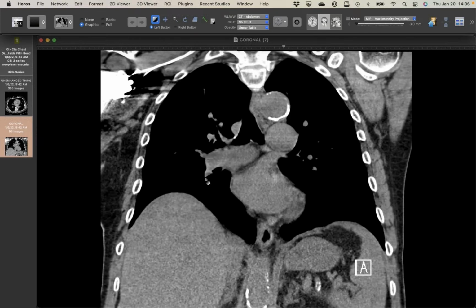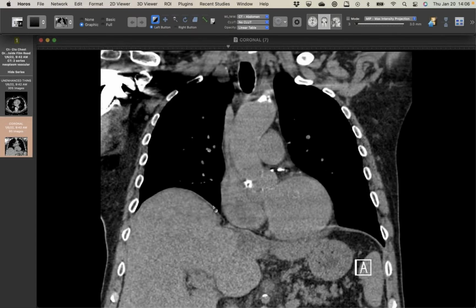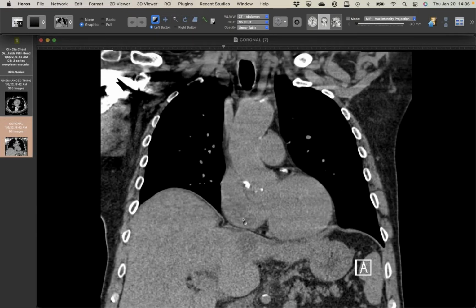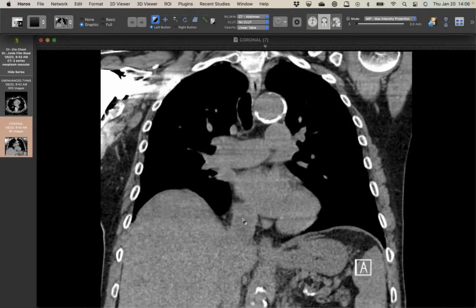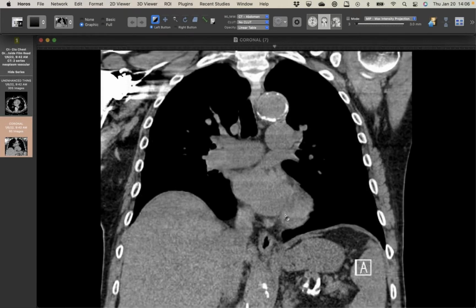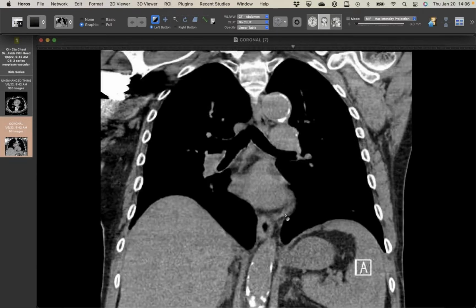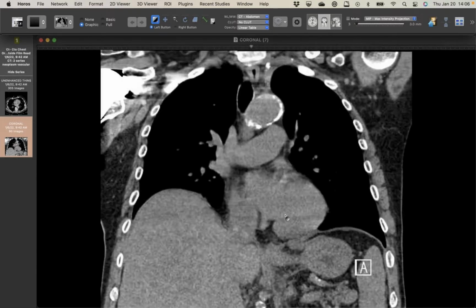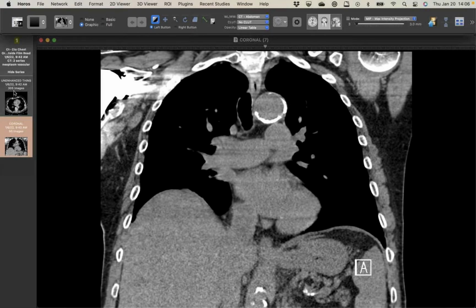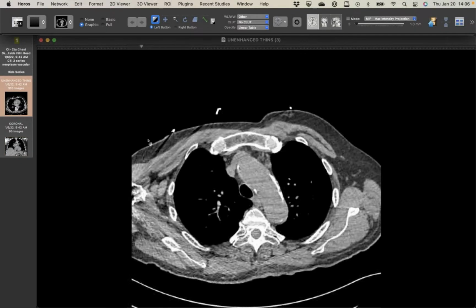I don't have tissue confirmation, but given the confirmed findings in the abdomen, I think this is extension of the tumor into the right atrium with probable tumor emboli in the lungs here. I think the patient had renal problems, so we suggested an MRI to evaluate this if it's going to change what they do. But just a reminder, you can see clot and tumor on a non-contrast.